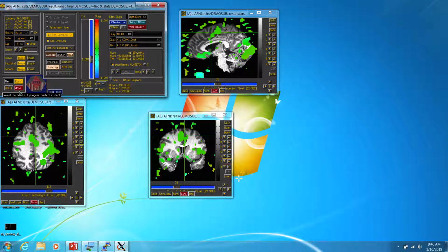Are you changing p-values when you scale up and down? Yes, basically this scale is our raw t-stat value. And then we have different descriptions of our threshold: a p-value and also a q-value. That's basically increasing the water level of the activation, and the islands in here are the places that were active enough to be above that threshold.